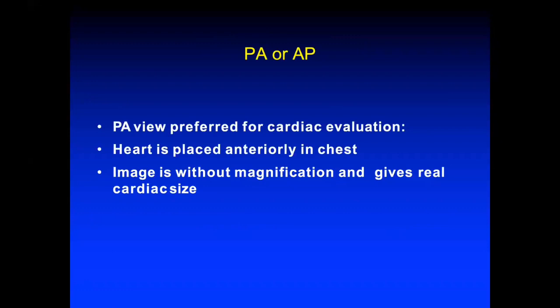So apparent cardiomegaly is a very big problem with AP views, especially when you are evaluating patients in a critical care setup. So never comment on cardiomegaly whenever you are evaluating an X-ray in a critical care setup, unless you are given a PA film. That is a very important point when you are given a PA film rather than an AP film.